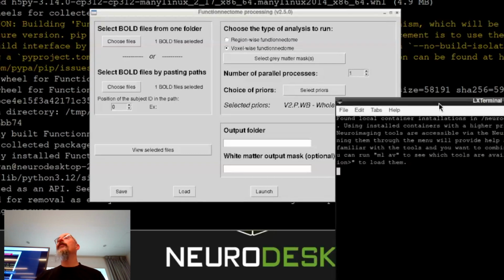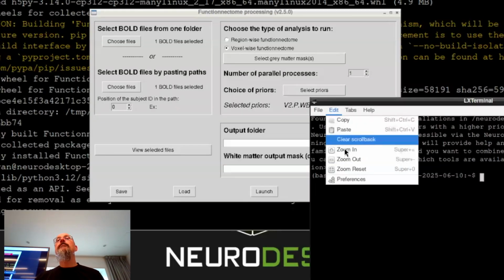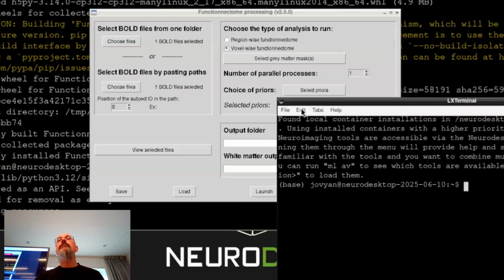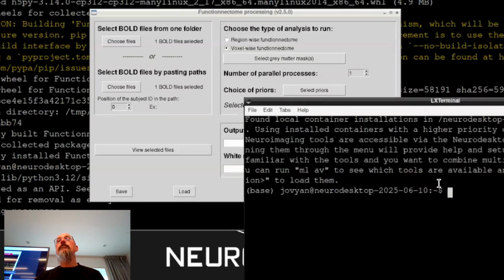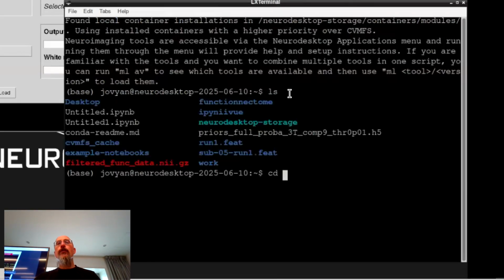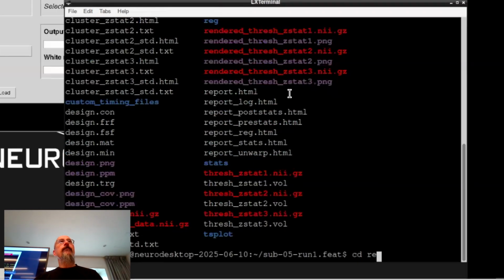No, it's in the reg folder. Let me show you again. You go to your feed folder, and the FAST.